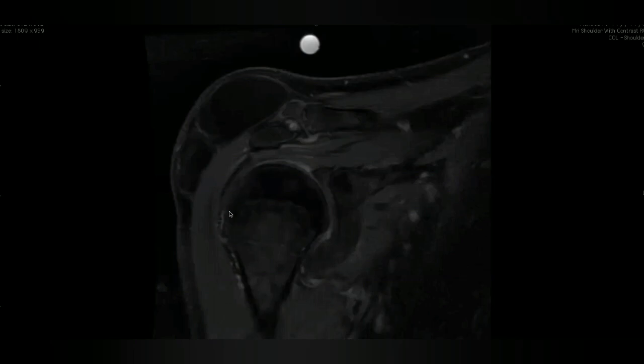First of all, you're talking about a liposarcoma. How much fat would you see in a liposarcoma? Sir, it will give heterogeneous signals. Of course. I just told you, lipoma variants can give you heterogeneous signal. Fat necrosis can give you heterogeneous signal. How would you differentiate between fat necrosis, lipoma variants, and a liposarcoma? So fat sat images. No, it won't. The only thing that can differentiate is a biopsy.